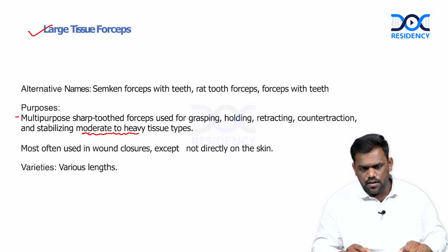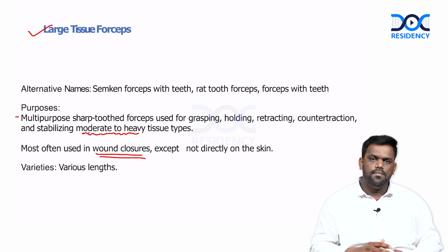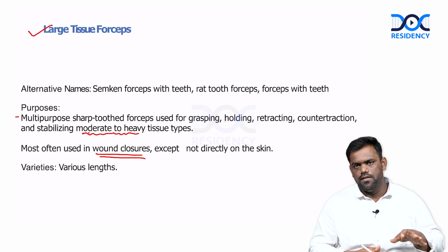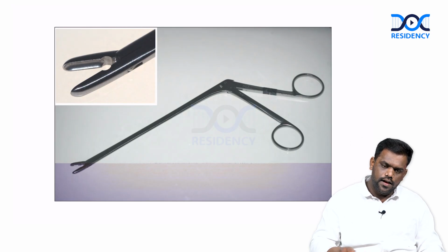It's often used in wound closure, but we should not use this directly on the skin, because the skin tissue holding forceps is different. Large tissue forceps.